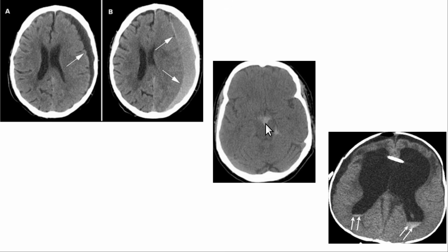Subarachnoid hemorrhage in the interpeduncular cistern, and there's also a little bit of blood here extending along the side of the midbrain, okay? You always got to look here because smaller bleeds can be this tiny and they can be missed. You always got to look at the occipital horns of the lateral ventricles for blood layering in that location. I see a bleed missed here once every 10 years. I see a bleed missed over here also about once every 10 years, maybe once every 5 years.